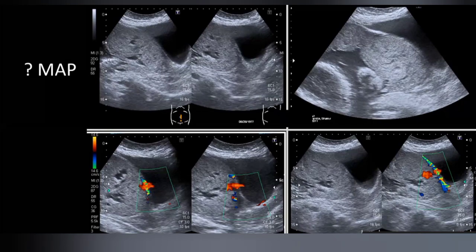And the good thing is that this is the least common. The commonest is accreta, which is not so severe as compared to percreta. So an important take-home point is, whenever you see placenta percreta or any grade of morbidly adherent placenta, it's important that you inform your primary physician.